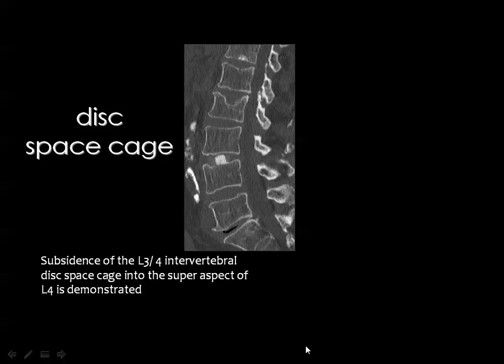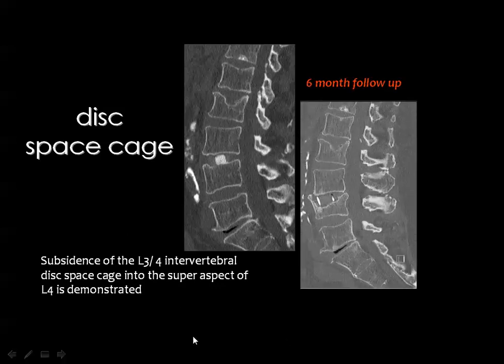Then after removal of the disc, there were many prostheses to be fixed at the site of the removed disc. And in time they discovered too many complications of these prostheses, and they started to change the type and the shape of the prostheses themselves in order to avoid these complications.